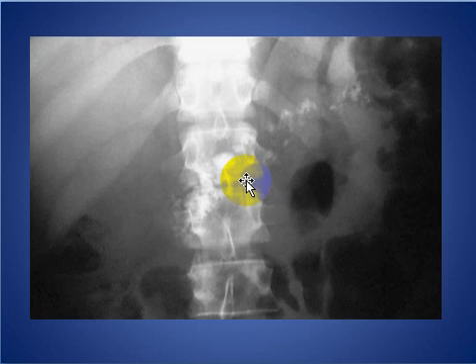In this patient with long-standing alcohol abuse, alcohol is the most common cause of this chronic pancreatitis with calcification. It accounts for more than 70% of cases. So this is a calcification in the pancreatic duct in a patient with chronic pancreatitis.